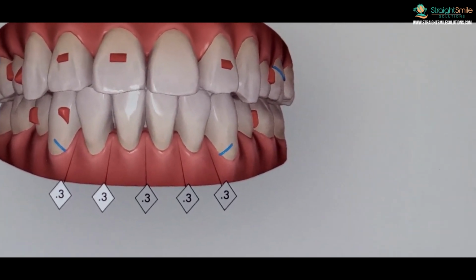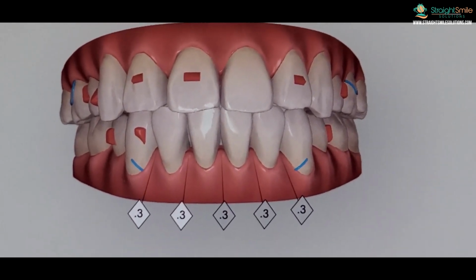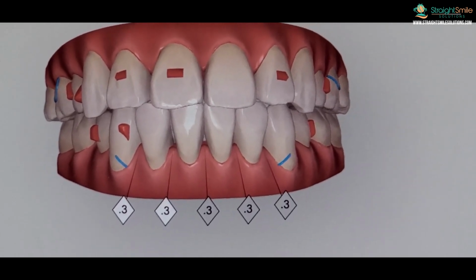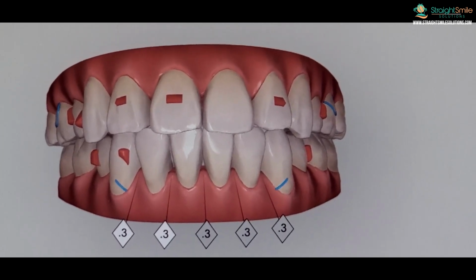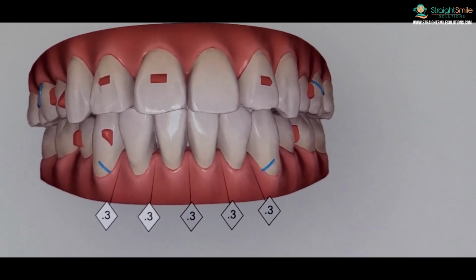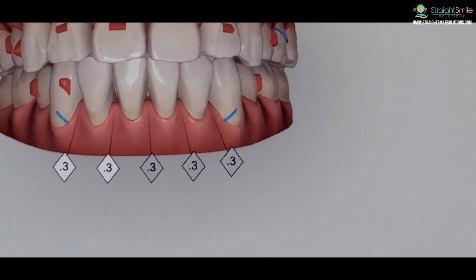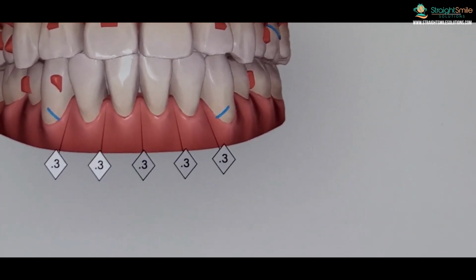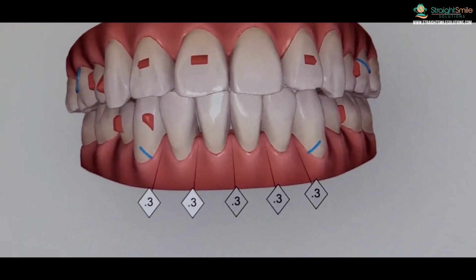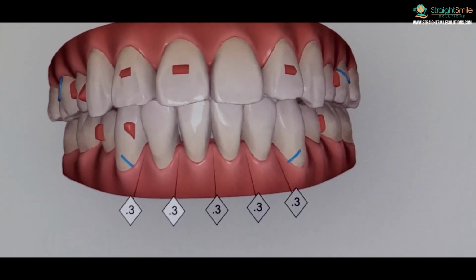So if you normally see your patient in office every 6 aligners, then stage your IPR at 0, 6, and 12. You kind of get what I mean? You have full control over this. You need to use an IPR system that's going to work if the teeth are rotated, so I definitely recommend the Garrison Fit strips. I don't recommend using a bur for that kind of stuff, because you're going to get all messed up if you do that. And you should definitely watch my IPR video before you jump into that. You can find my IPR video at gpwebinar.com. Hopefully it's helpful for you. But yes, you have full control over your IPR.